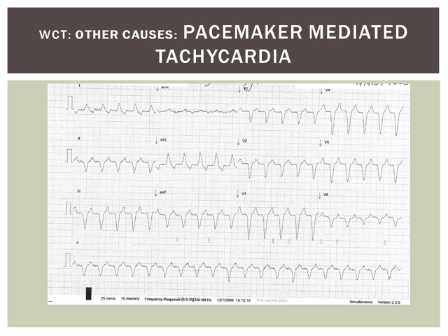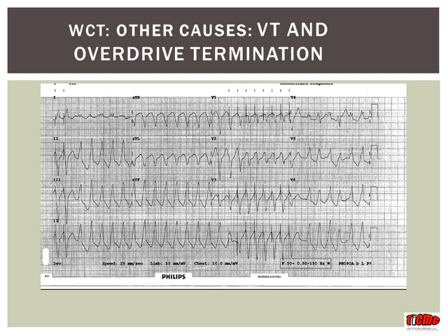Here's one we saw the other day. This is a broad complex tachycardia at about 125 beats per minute. This is actually a pacemaker mediated tachycardia where the atrial and ventricular leads of the pacemaker can actually form a reentrant circuit. In this situation, you usually sit at the rate that your pacemaker's max is set up at, and they're often between 120 and 130, which is one of the giveaways.